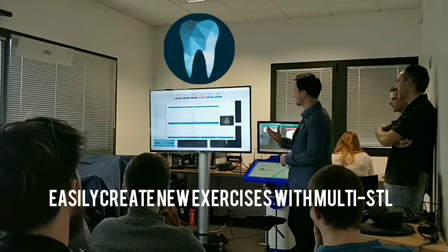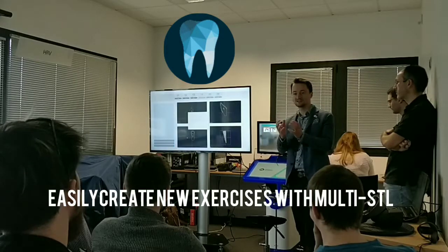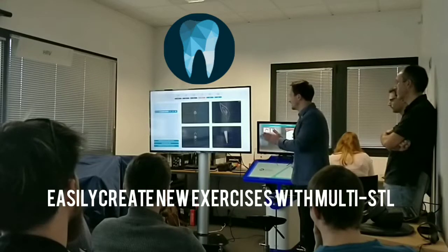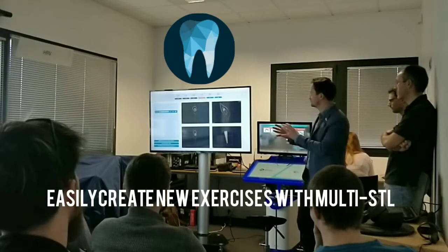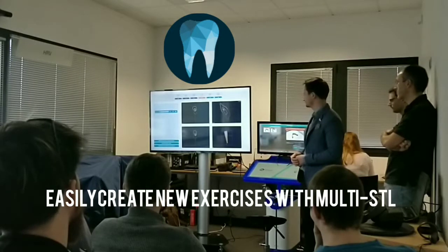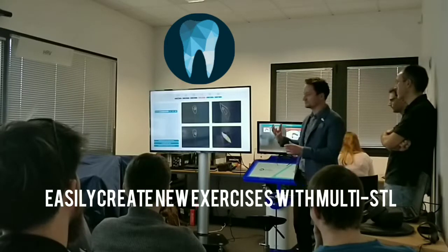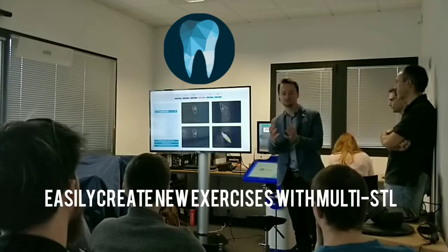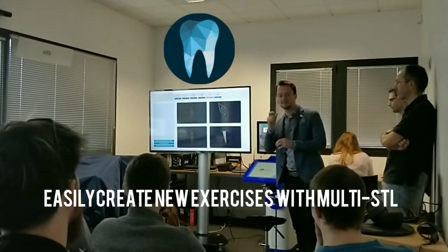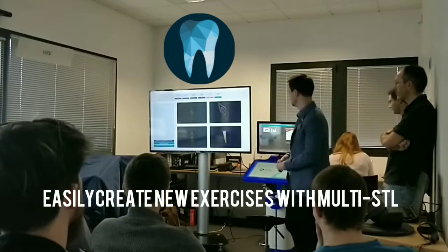So this next step, we can actually create a new caries shape from geometric objects that we've got in our library. And these can be moved around, they can be deformed and changed to fit the exact case that we're trying to create. And so this is fantastic because it means that we can actually import intraoral scans, which are in STL format, from real patients, and we can actually place the caries exactly where we want it to be, which before this it wasn't possible.